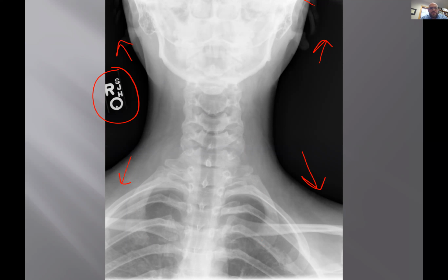It does look a little bit thicker in this first rib, and sometimes first ribs can get stress fractures in them. I don't see callus formation around the rib or anything that would be more specific for a stress fracture, but it is a little thick, so it could be some stress reaction of bone in that first rib. But everyone look at the ribs now based on that finding. What else do you see in the ribs? How about the fourth left rib?